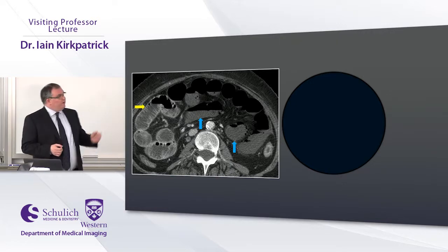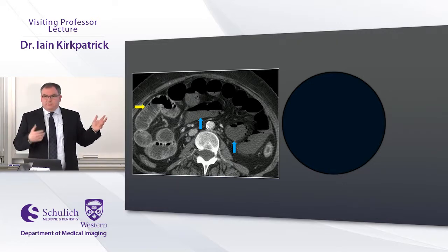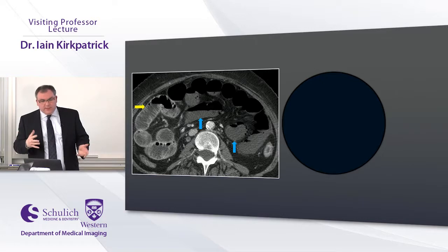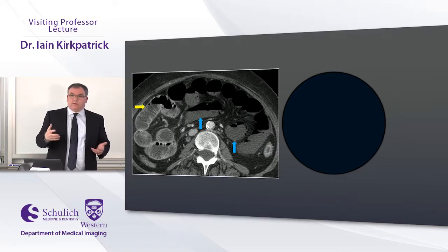What you need to do is find some loops in the abdomen that you really can convince yourself look like they're enhancing normally. And then once you've established a baseline for that patient, then go look around and see if you find ones that look different.